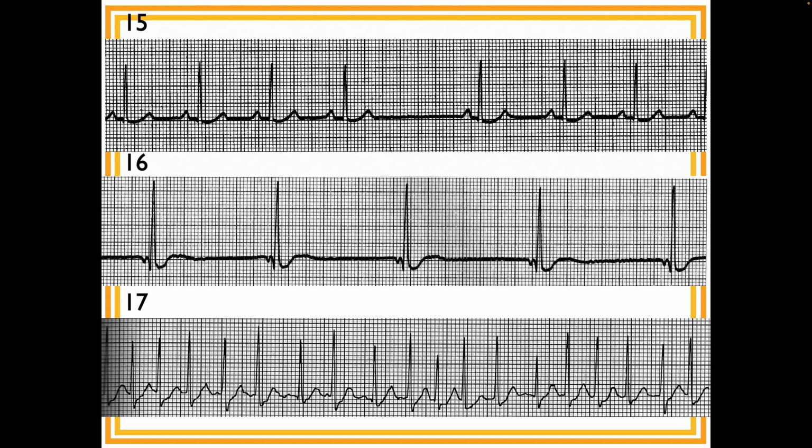The rhythm I think is irregular, the rate I think is around 170. I see P waves maybe with a normal PR. I think those P waves, it's so fast, I believe those are T waves. I see a couple, one upright, one inverted, and sometimes I don't see any. So I was thinking it was more of like MAT.